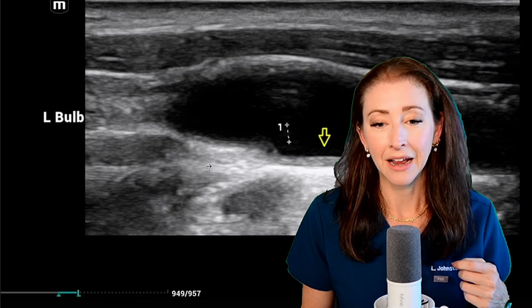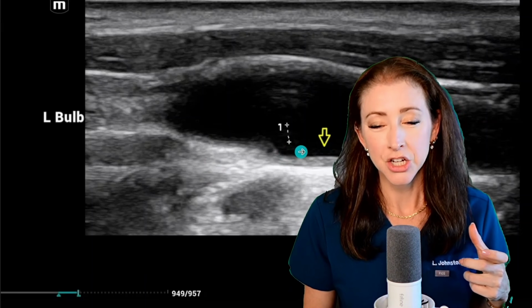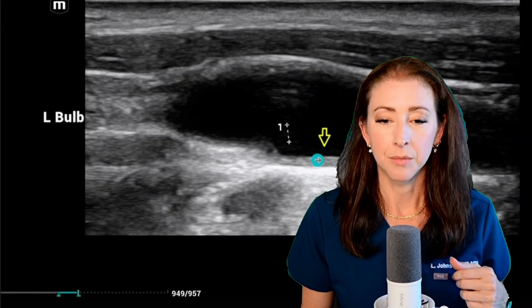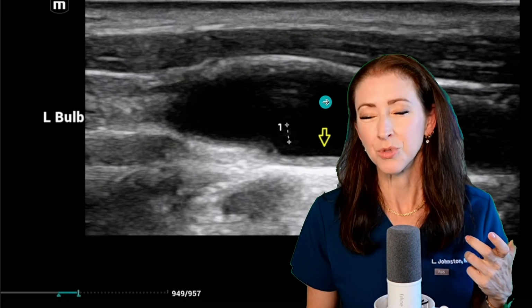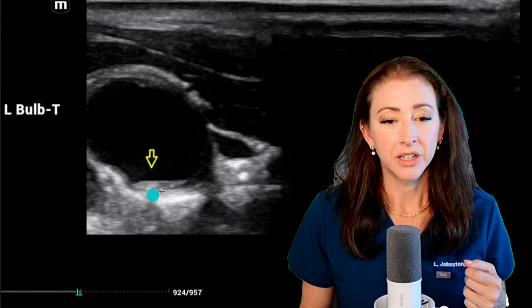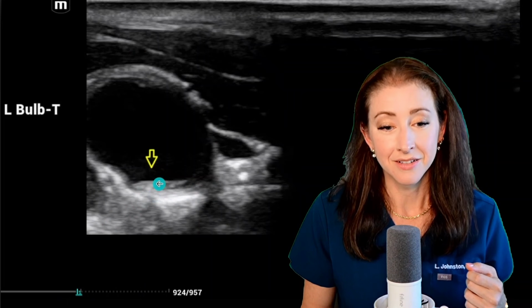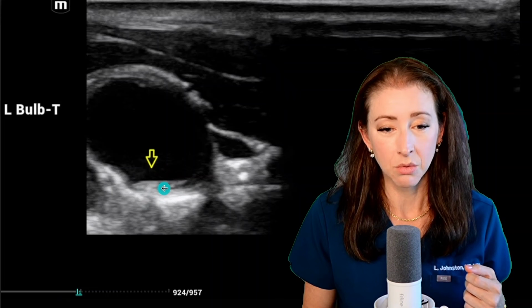looking for plaque. Here, this is not quite as distinct a shape, but it again looks thickened to me here. This is not completely normal artery, but it's not quite a plaque either. I'm really not happy with how that looks. It could be thinner, and that would be nicer for me. Again, we're going to look here down the barrel. The outside wall of the artery is here. There's, again, this sort of meniscus or this sediment here that you can see within the lumen.